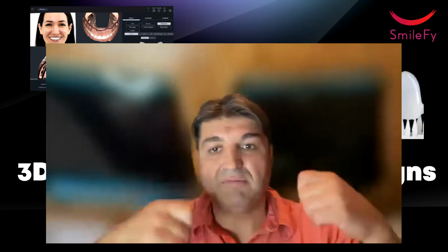You can print the mockup, you can print only the teeth, you can union all the teeth, and then you can create a difference, like shells. So all this is possible, and then you can print a shell mockup, you can print whatever you want.